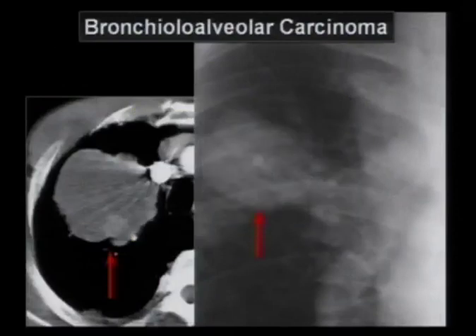Here's the most common manifestation of bronchioloalveolar carcinoma. More than half of them will present as solitary nodules or masses. Pretty good sized lesion here on the left side of the screen. You can actually see a little enhancing nodule in here. This patient on chest radiograph, you can actually see a little focus of what turned out to be calcification in this lesion. Calcium is usually more often associated with benign causes of nodules, but when you see this much non-calcified tissue, you certainly have to be worried. And I'll make that point again during my interesting case talk, and tonight when we do the unknowns.